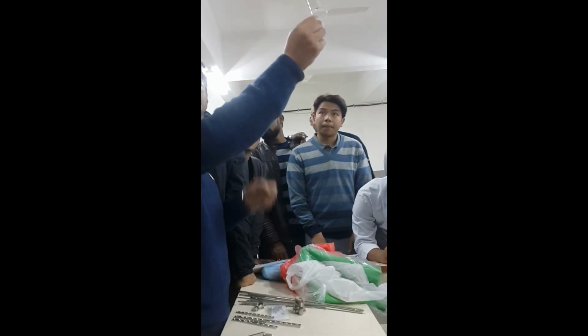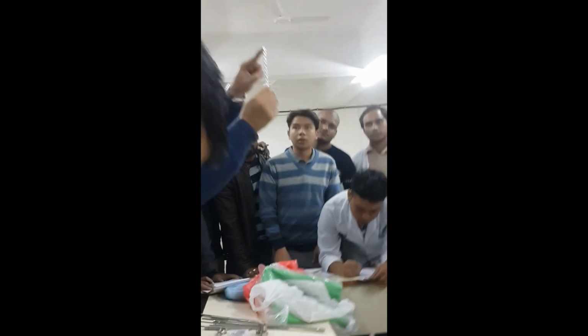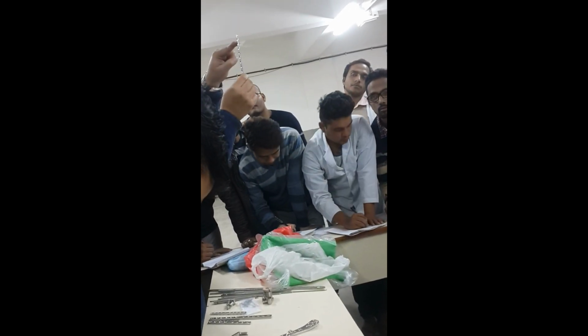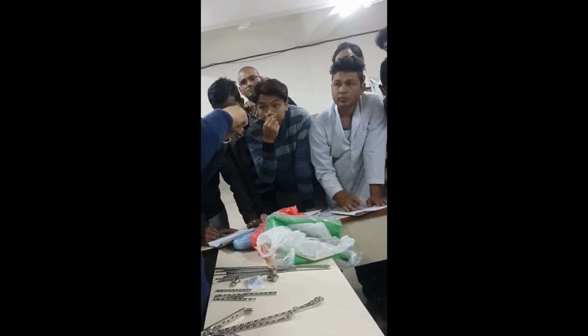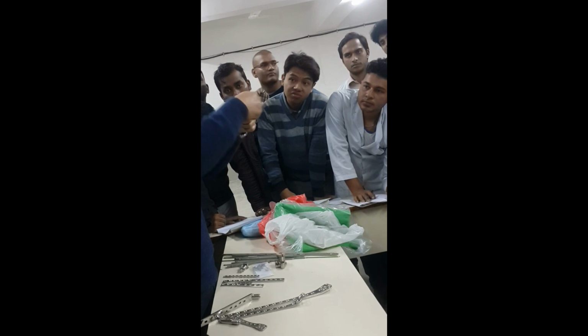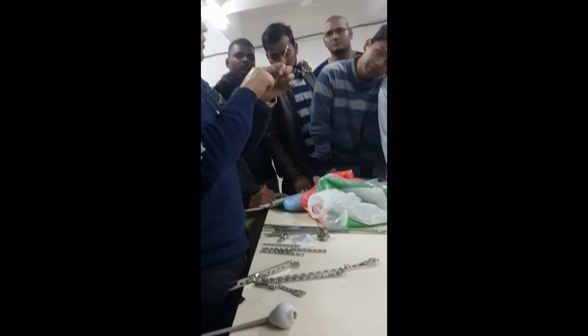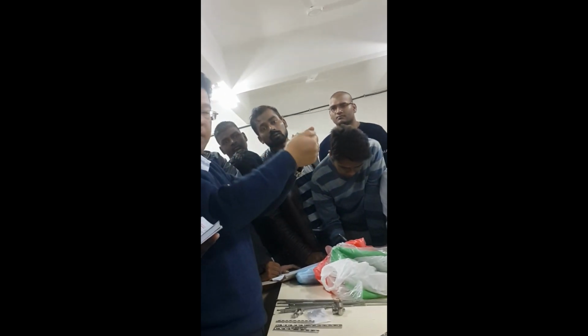Now this is the recon plate, which means reconstruction plate. It is like a DCP, but at the end of this bone, notches are made. And it is for reconstruction, which means you can just bend it. It can be bent this way or that way, or you can make it an S shape. This is used for the clavicle. With a plate bender, whatever shape you want, like the S shape of the clavicle, you can make this. You can bend it laterally or in the AP direction.